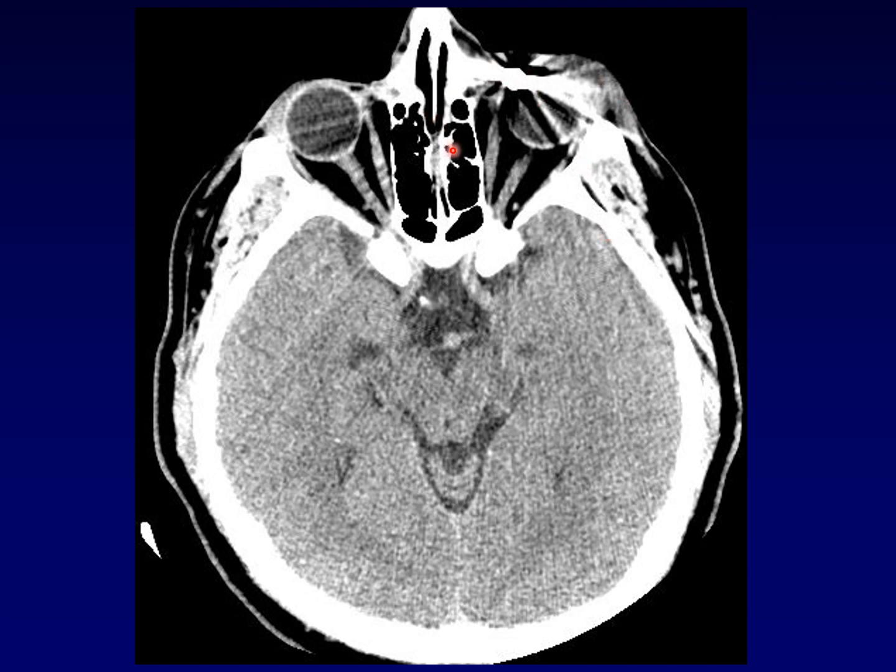What could be so dense that it absorbs essentially all of the X-rays? Metal. That's what's so dense. This is actually a small sphere of metal, and everything else out here is normal. It's just been obscured by that metallic sphere. This is a BB in someone who got shot by a BB in the eye.